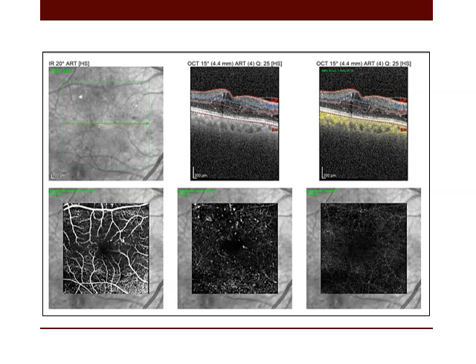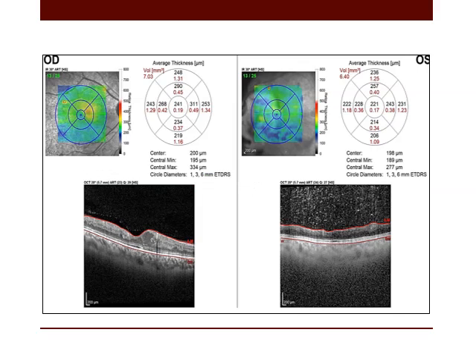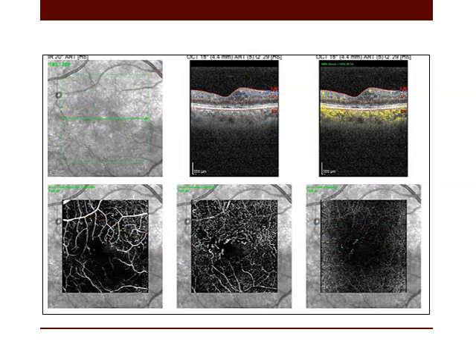The cystic spaces usually appear hypo-intense on OCT angiography. Another patient, it is evident that there are cystic changes in the right eye. The left eye is a thin macula. When performing OCT angiography in the right eye that presented with cystic changes, we could see that there are marked ischemic changes involving both superficial and deep capillary plexuses.